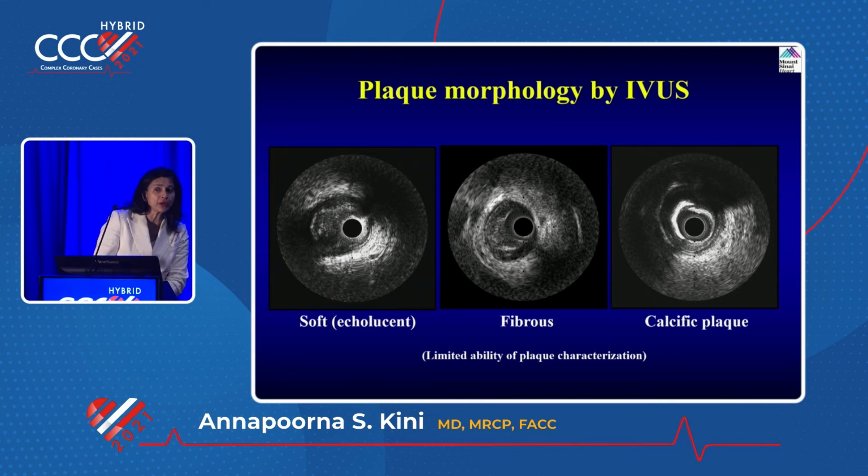That's when yesterday all the discussion was happening. What's the kind of treatment you need to do? Those kind of questions, they may just show you this and then ask you different kinds of devices that you want to use. Now, once you see what calcium is, then you know to differentiate what fibrous plaque is. You can see clearly this is fibrous tissue, compared to the calcium there. That's a big difference, and this is how you see this plaque.